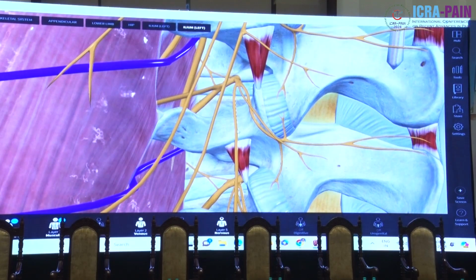So it is very common that your longissimus is contracting and you are thinking it is multifidus, because these two muscles are very close. And just now I have shown you that the multifidus is a little deeper than the longissimus muscle. So for the multifidus contraction and the longissimus contraction, just looking superficially at the movement over the skin and the movement of the needle, you cannot differentiate between these two. You cannot appreciate which one is actually contracting.